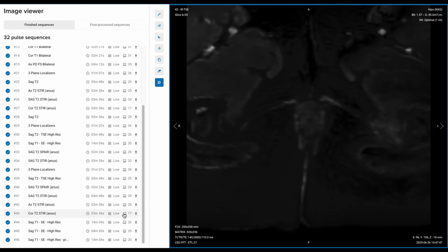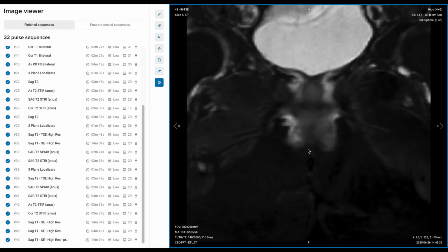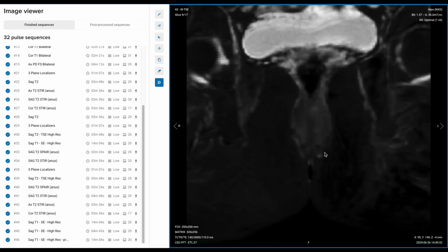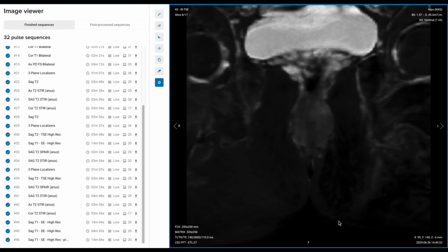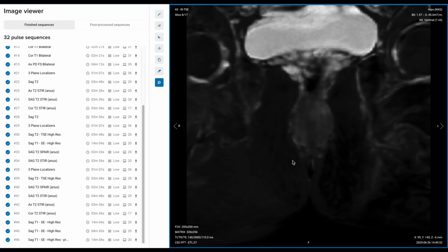For the coronal, we'll review the spread or horseshoe tracts, the ones that come sideways obliquely and aren't as well visualized in the axial view. The coronal highlights bilateral and translevator spread if they go up obliquely. Unfortunately, it's hard with this case because it doesn't present pathology. But a teaching tip I can give is to really make the best use of fat saturation, because if there's pathology, you'll see bright signal across the fat and very bright signal from abscesses or inflammatory fluid.